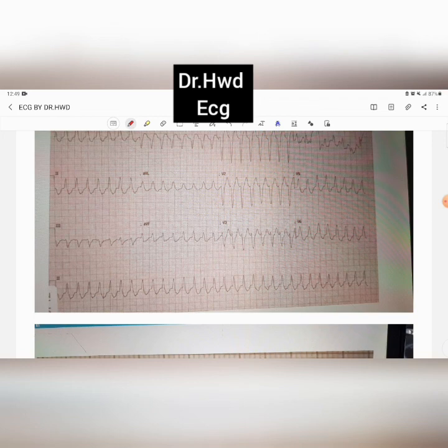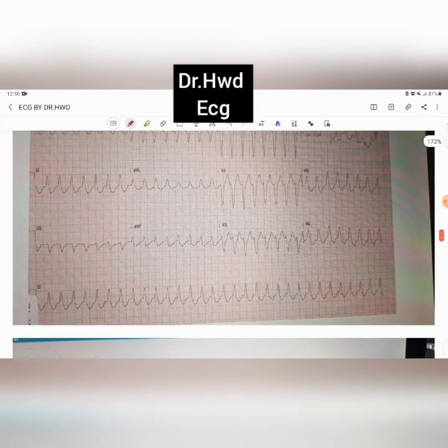Now when you're looking at the QRS complex, right, first let's see whether there's a tachycardia or not. So looking at the RR interval, this is your RR, okay, this is your RR, seems like a tachycardia, but to determine whether it's a problem of the P waves or the QRS, you have to look at the P waves, right? Do we see prominent P waves? We don't in here. I mean, they're kind of fine, but we know that there's a problem with the QRS complexes. Look at the QRS complexes, right?